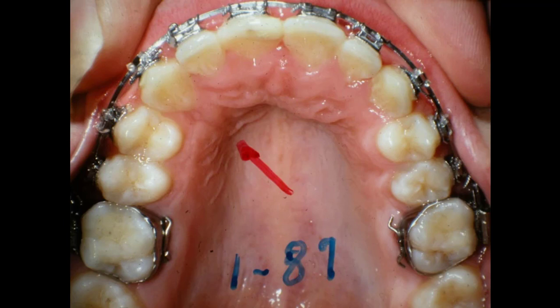Now, when you take a tooth out of the palate, like a cuspid like this, and we drag it over into position, it's lined up real good. He chipped that tooth right there and had a replacement that's not too hot. But look at the track that it made through the bone structure, and we left that.